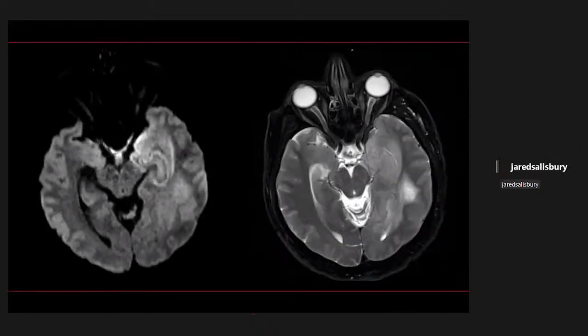What do you think? What in the world is going on here? I don't know. A white matter demyelination, or considering the restricted diffusion... I don't know, seizures cause restricted diffusion. Yeah, they definitely can. There's other things that can cause restricted diffusion. I don't think this would be a repeat case of mesial temporal sclerosis. Okay. I don't know, maybe it could be an infection.